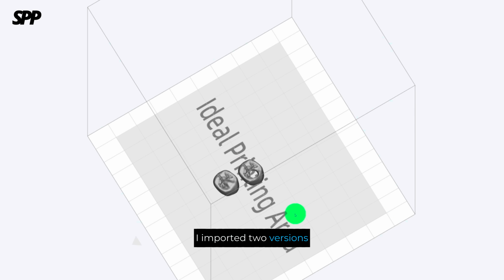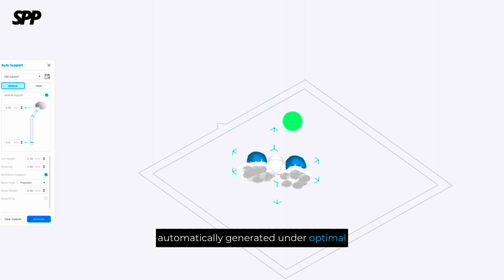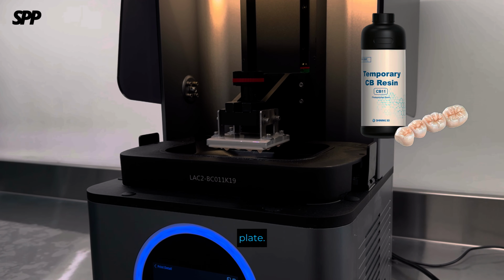I imported 2 versions in total. One has a screw hole and the other does not. I used the auto-arrange function for the crown and the supports were automatically generated under optimal conditions. I printed the crown using a small size build plate.